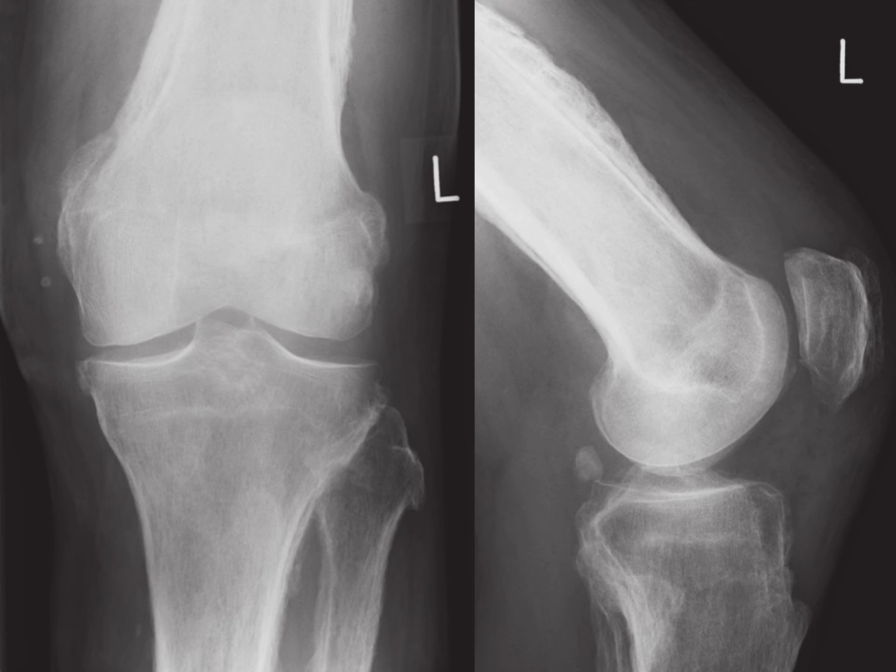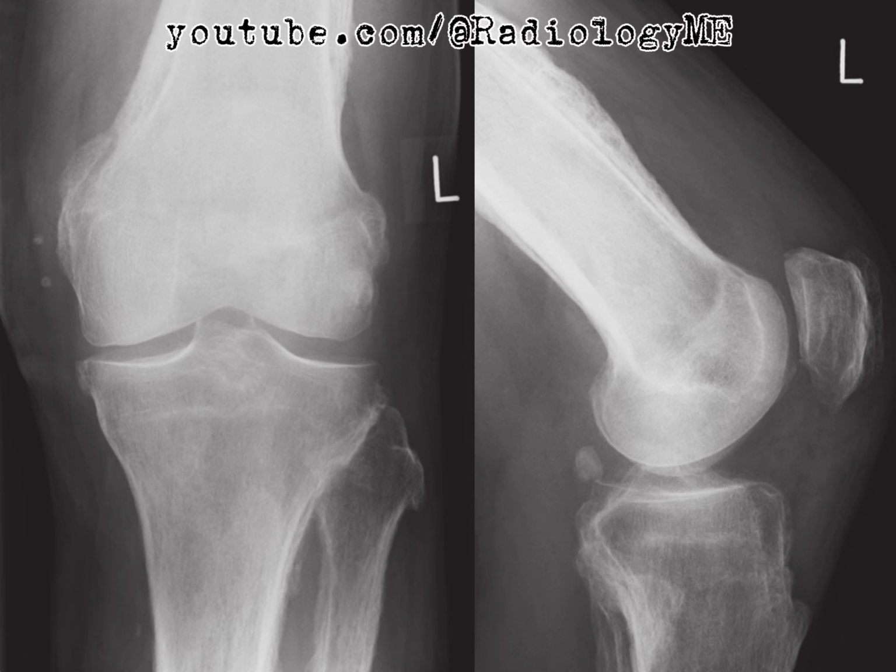Let's start by examining the radiographs first. The AP and lateral views of the knee show distinct periosteal thickening involving the diametaphyseal regions of the tibia, fibula, and femur. The thickening appears lamellated, suggesting a periosteal reaction, but what's crucial here is the sparing of the epiphyses. This immediately helps narrow down the differential diagnosis.